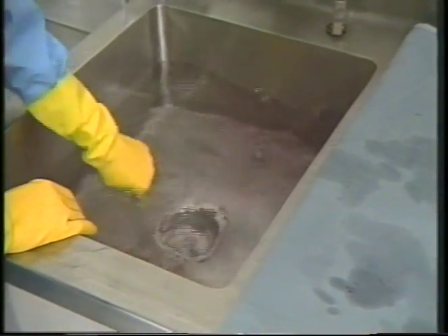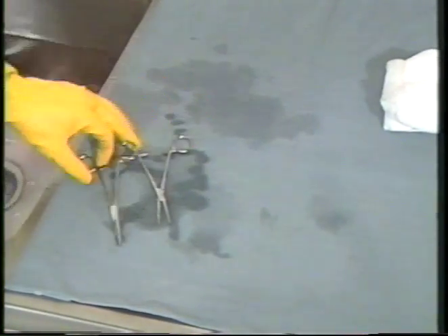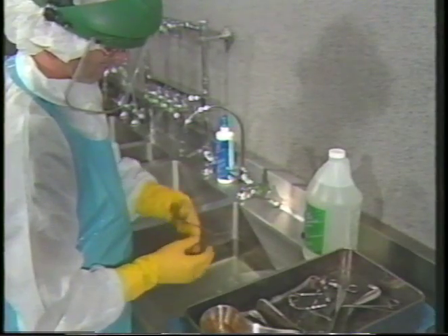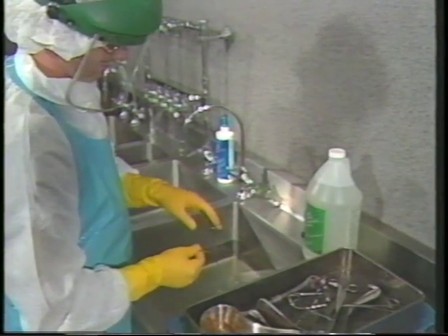Water is the universal cleaning agent, and an adequate supply of water is the strongest weapon in removing soil. Water serves as the medium for carrying the detergent to all the surfaces of the load, aiding not only in coverage, but after contact, removing the separated soil. Unfortunately, not all water sources are suitable for use in washing systems.